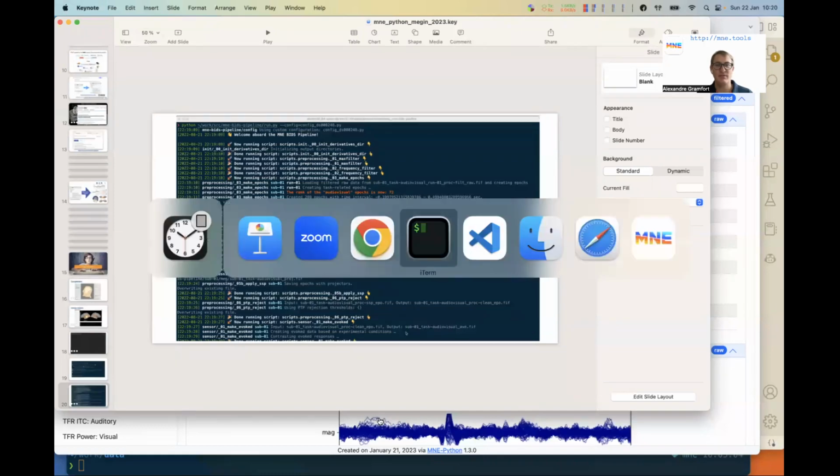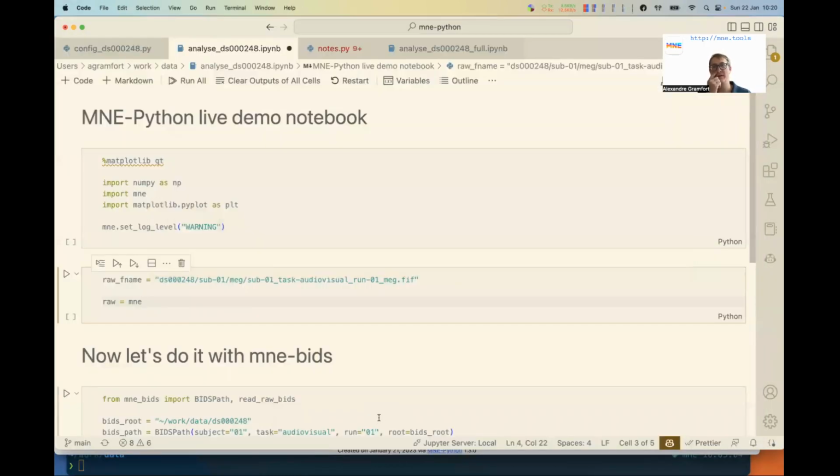Okay, so let me jump into this tool. This is VS Code, but this is just a way to create a so-called Jupyter notebook, and we'll use this for our tutorial today. All right, so you may be familiar with the standard Jupyter notebooks or JupyterLab, and this would be your way of working. Here, I will use this to also show you the power of such a text editor. Okay. All right, so I've copy pasted a few lines already to get started.